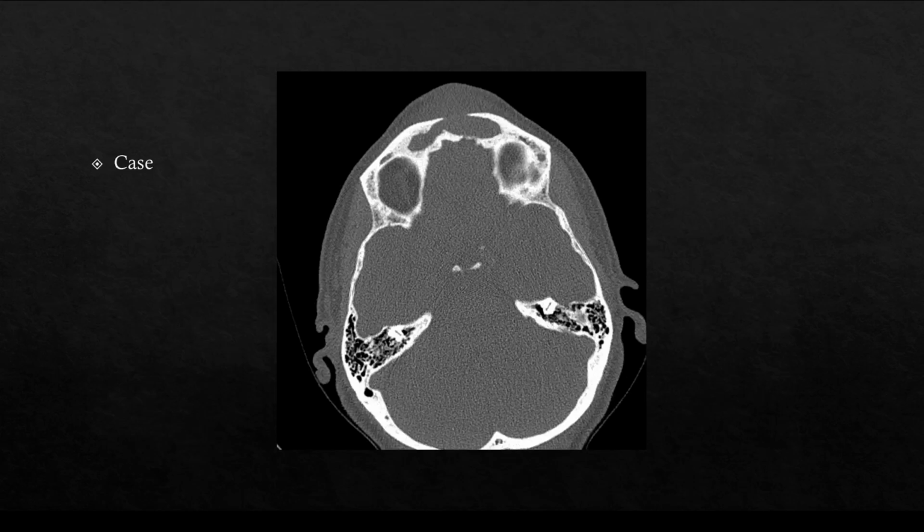Here we have an example of a frontal sinus infection with anterior soft tissue spread rather than intracranial. This would present as a mass clinically. Note the dehiscence of the sinus anteriorly. The eponym associated with this finding is Pott's puffy tumor, because it looks like a tumor clinically.